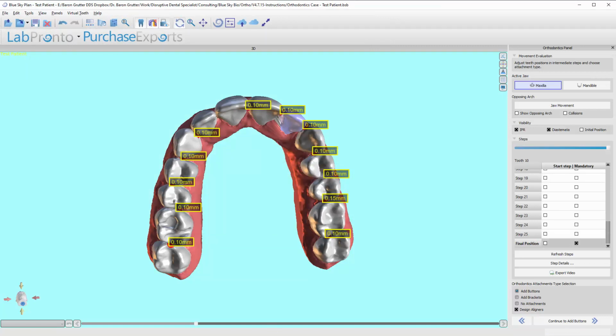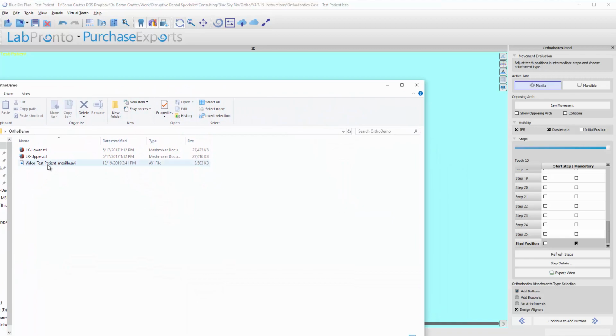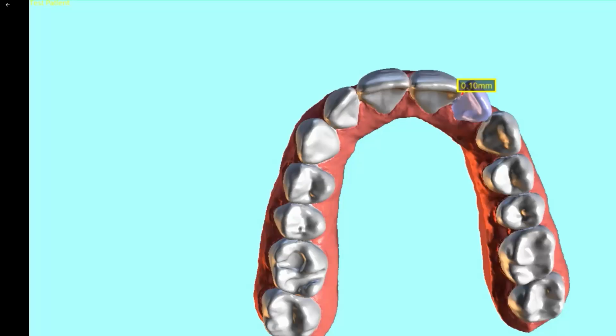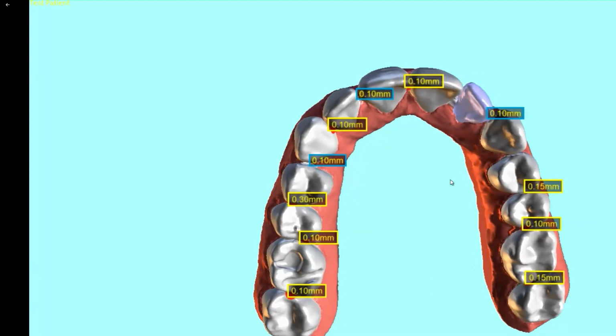So now if I open up this, it's going to show me a little video. Sorry, my screen is not the right proportion. Well, I think you can see most of it within your viewing screen. You can see it moving.